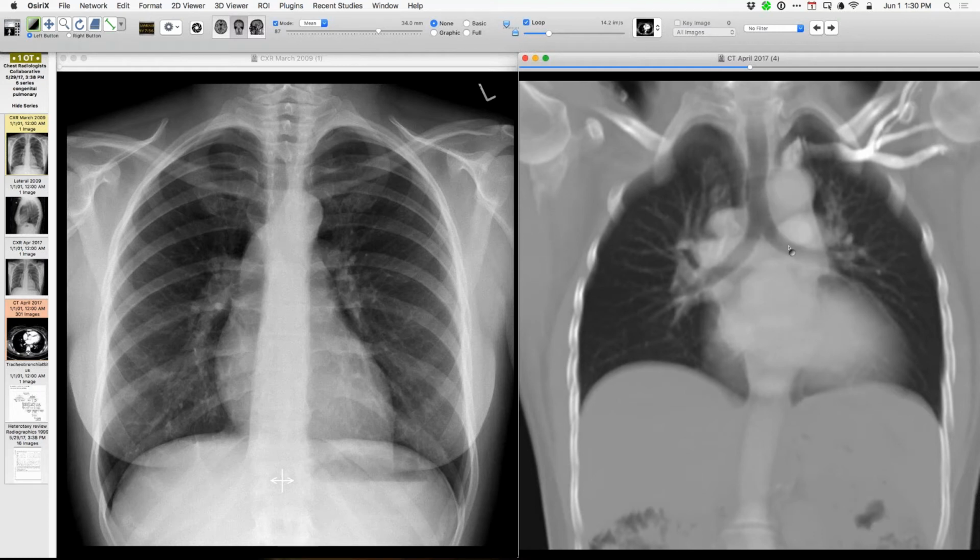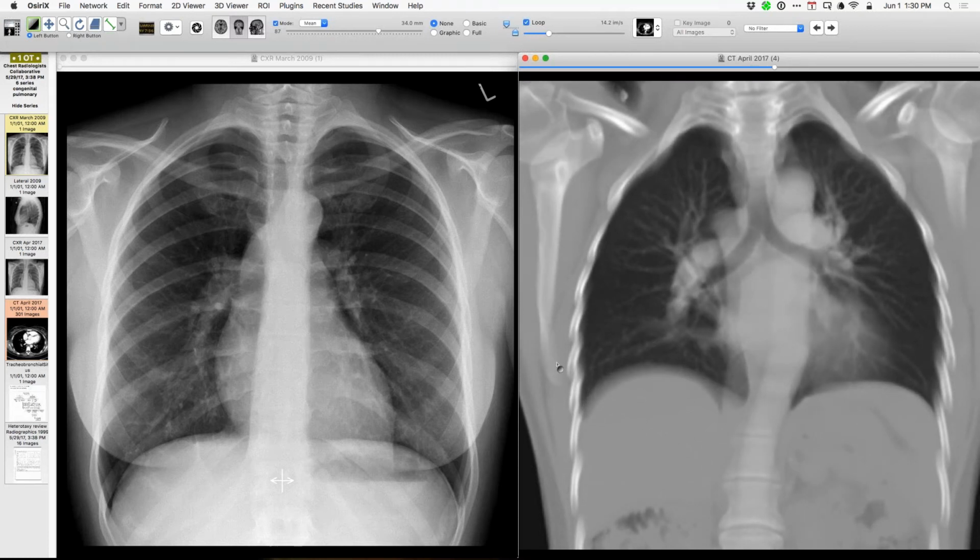So here on the left side, we recognize the usual anatomy. Our left main bronchus is beneath the corresponding pulmonary artery. But on the right side, you can see we have very similar anatomy. We have this relatively long bronchus, and we can see that it is underneath the corresponding pulmonary artery. So both of these bronchi are hyparterial bronchi. The other observation is this thing, which is a distended azygos vein. We'll get to that in a moment.